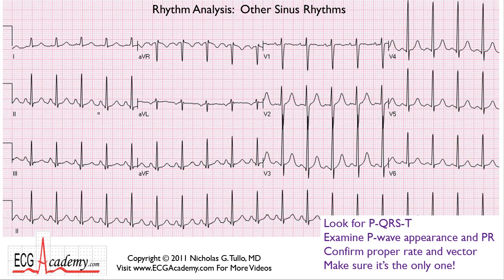Now here we have an example of another ECG. Remember, look at the forest first. If you scan across that rhythm strip, you can see the R to R intervals look to be quite regular if you glance across. And now let's find the rate. It doesn't really matter what sequence you do this in, as long as you try to be consistent when you approach every ECG so that you don't miss anything.